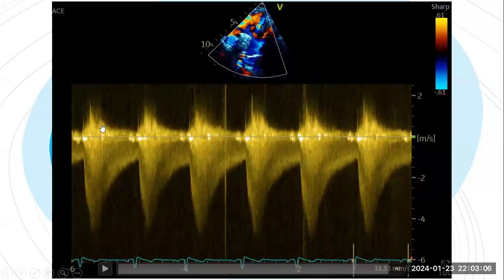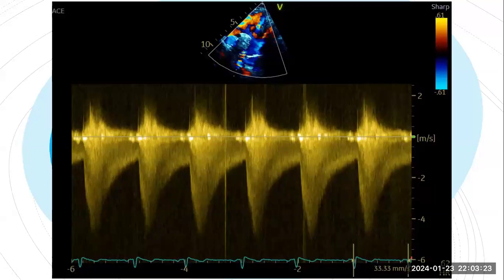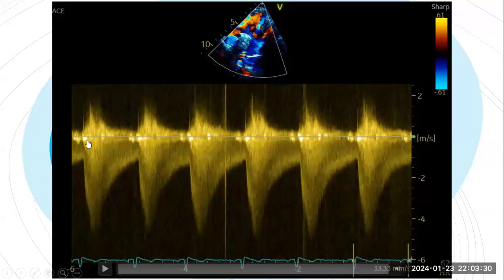Excellent. First of all, you can see in the systole there is very high velocity. The velocity is more than 4 here, almost reaching 5, so the gradient is going to be around 90. And as Abdurrahim mentioned, there is what we call the diastolic tail. There is diastolic continuation of the forward flow. You can see high velocity continuation of the forward flow with less velocity during the diastole, but it did not go back to the baseline.